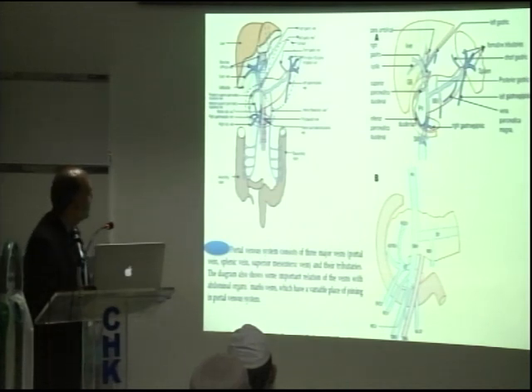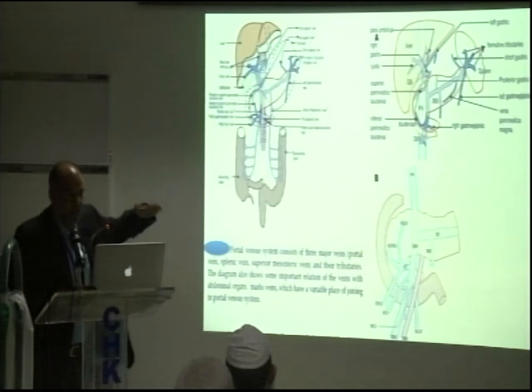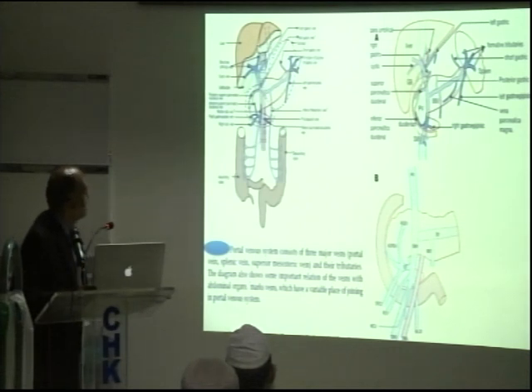But now let's flip this patient. So he is going to be like this. The liver is going to be here, the spleen is going to be here, the splenic vein is going to be here, the portal vein is going to be here, and the mesenteric vein is going to be here. So just flip the image. That's what actually the position of the patient is. I should have flipped them for you. Next time I'll do that.